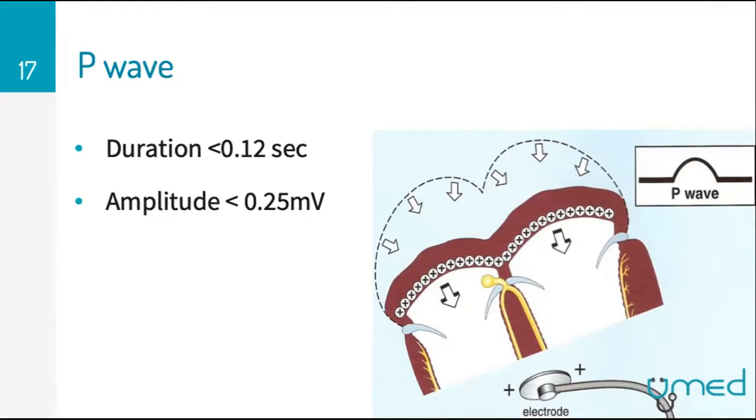When you're interpreting ECGs, you're actually required to know these two things. The P wave is important because it helps you determine if you have a heart that's beating at a regular rhythm or not, right? So whenever you're interpreting an ECG, you have to assess the P wave to see if the duration is correct, and you assess that duration by using your x-axis.